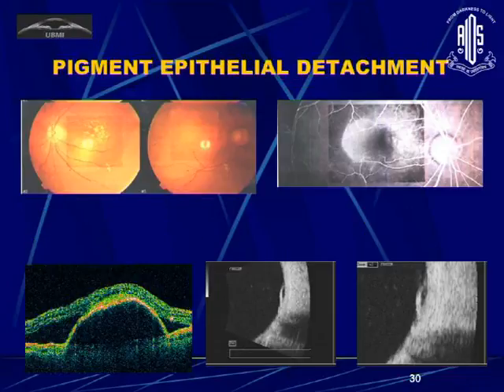Now, the 20 megahertz probe I used to use in an era before the advent of the OCT. And then when the OCT came, I started comparing with that. But you can compare the 20 megahertz probe with the OCT here. We had a large PED which is seen on the 20 megahertz. But of course, there is no way that you can say that this is a replacement for OCT. OCT obviously shows much, much more than that.